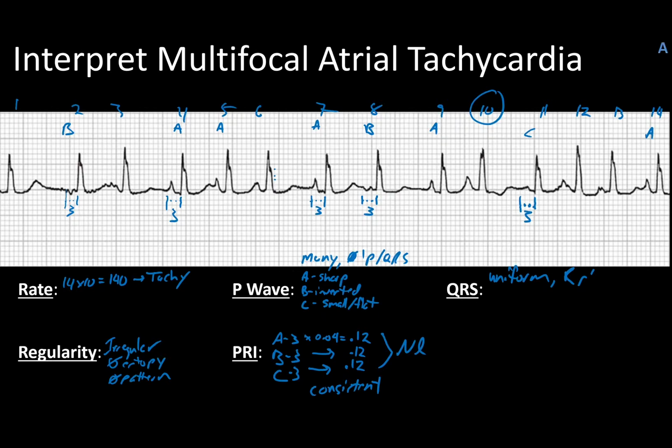And what is the QRS going to be for these? Well, let's go ahead and measure that and that, and that's at a 2. I measured on number 6, but if you check any of these, even number 9, that's right at a 2.